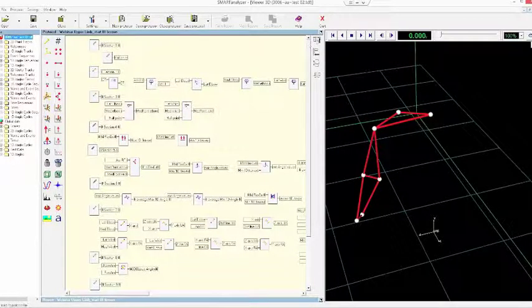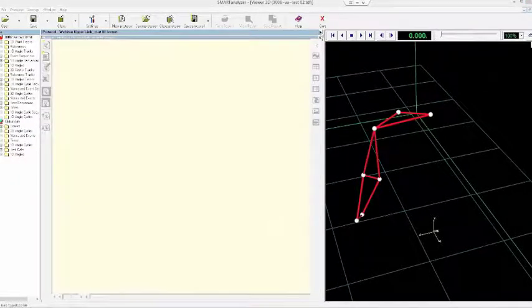To start creating a new report, we need to open the report panel. The report panel is the workspace in which to build a presentation report. The report panel is below the protocol panel. To open it, we have to click on the little button on the upper right corner to hide it and show the other panel. The toolbar on the left contains the page editing tools used to create or delete pages, to change their order, for example, or to edit their headers.